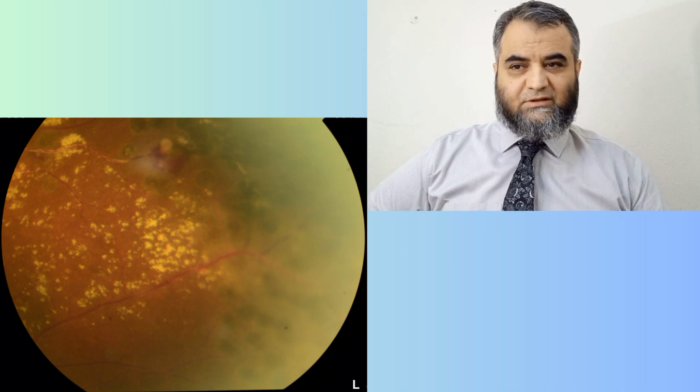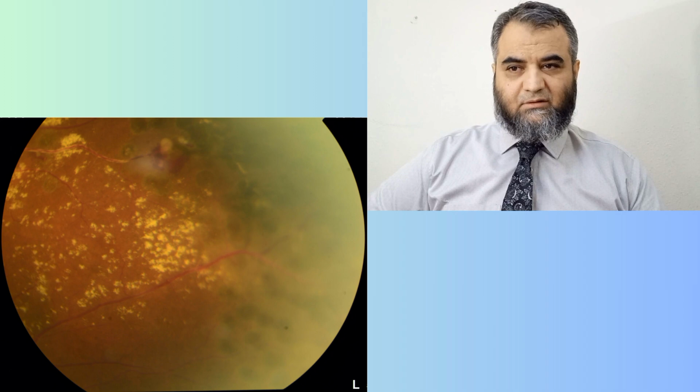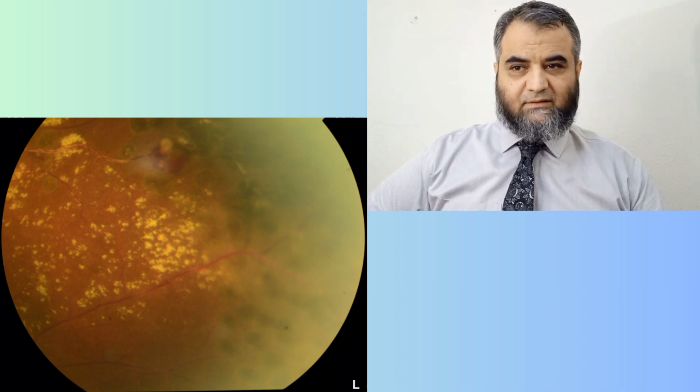And there is also, you can see, a ruptured macroaneurysm, which is leaking superiorly in this photograph. Otherwise, the same miliary distribution of the hard exudates in the periphery, just like seeds or raindrops, you can say, which is occupying there.